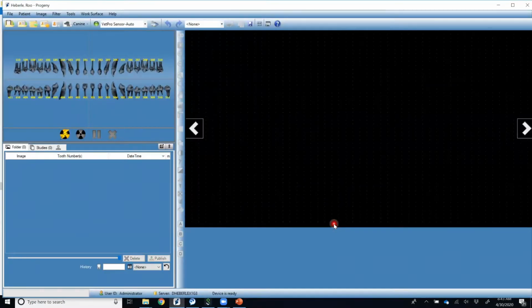Now this brings me right into the patient record and I can begin acquiring images. Now let's cover how to open an existing patient.